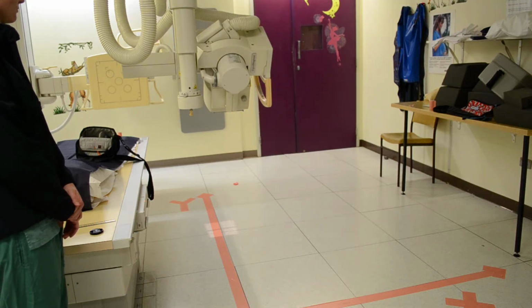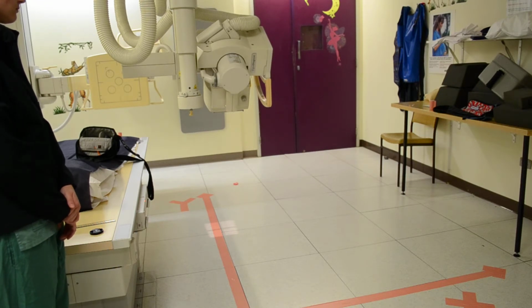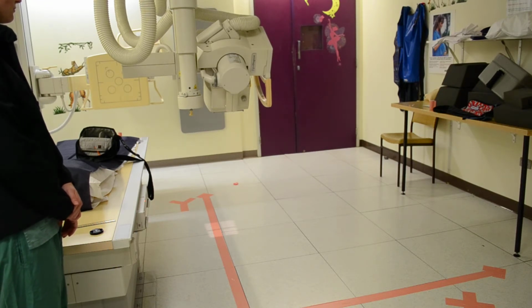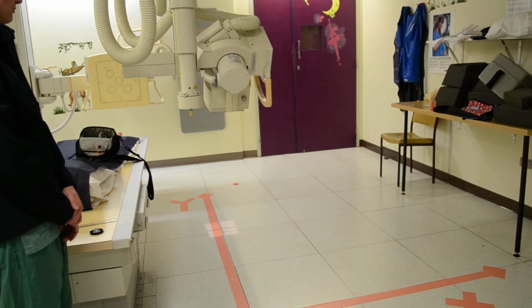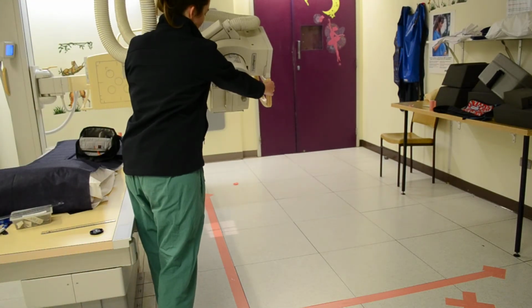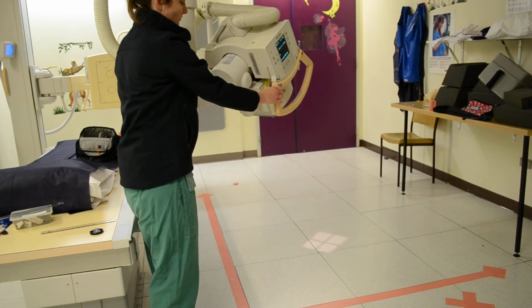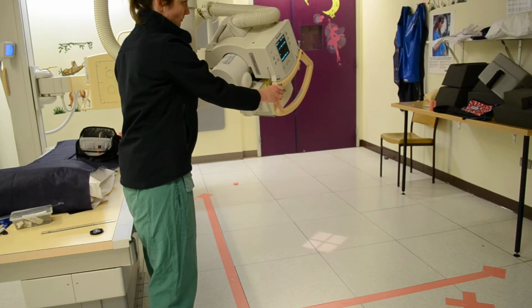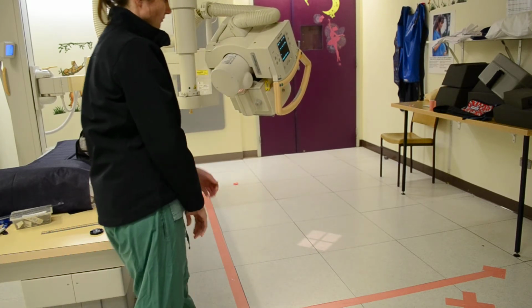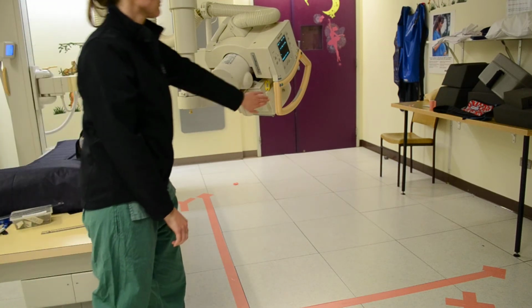Now the specific question that we're trying to answer is not what's happening when we angle along the Y-axis, and not what's happening when we angle along the X-axis. It's what happens in between. So as we rotate through 90 degrees, you can see the light is describing an arc here. We're halfway now, halfway between the X-axis and the Y-axis.